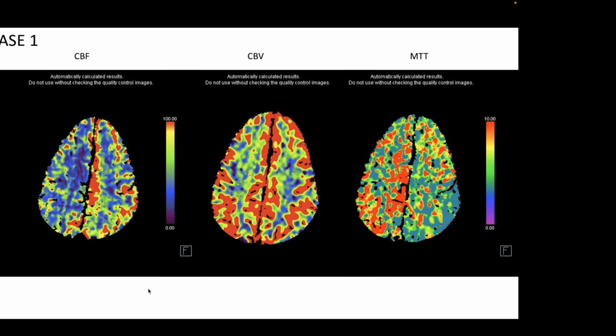Yes, it's me. What do you think about these scans in this patient with this kind of odd, it's not paralysis, it's like a clumsiness of her arm? Actually, really, I'm not the MRI specialist, but some discrepancy in the parasagittal frontal areas. Good. Yes. Yep. Good. So, which side do you think is abnormal? The right side is abnormal. Good. Okay, so let's look at this.